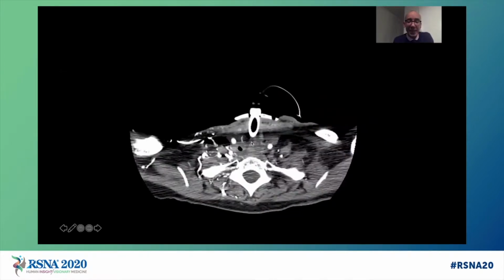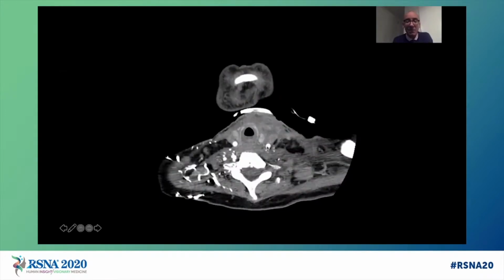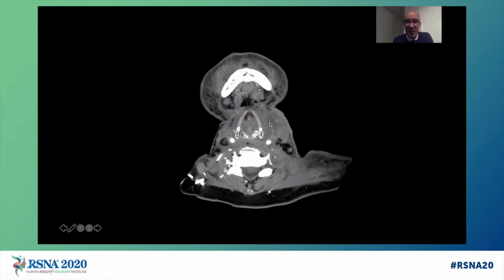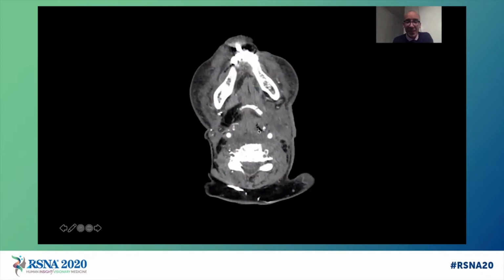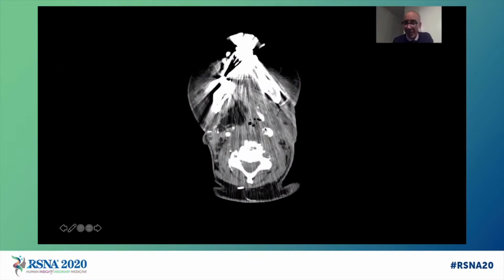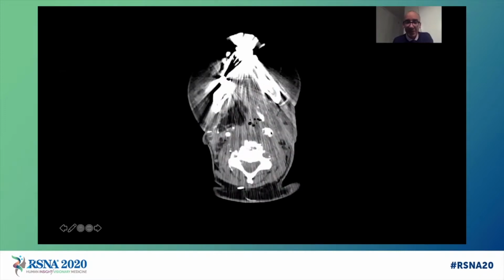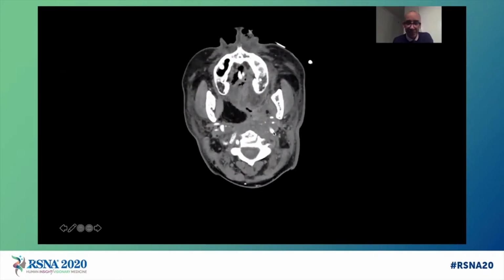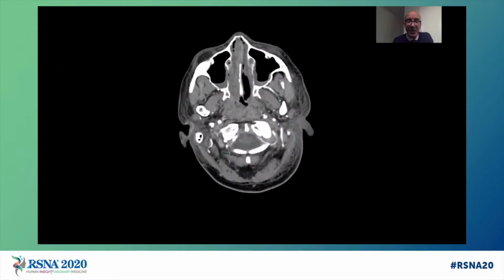We see her tracheostomy, this sort of diffusely edematous look to the neck, which is common in post-treatment patients. And then here in the left neck, there's this low attenuation area with some gas bubbles and a trail extending to the pharynx. And those gas bubbles are coming close to the distal left common carotid artery. Oh, what's that? Well, we'll take a closer look at that in a moment. But it's important to look at the soft tissue windows to just see what's going on around the vessels.